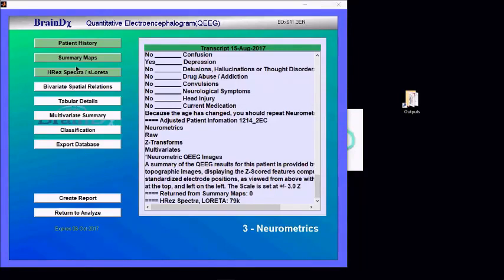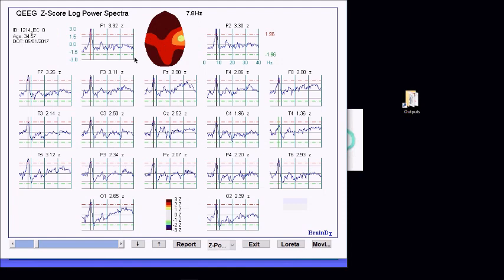Having looked now at the wideband information, we have the opportunity, or the necessity actually, to recalculate the same information with the same methodology, but now on a high resolution spectra. So instead of delta, there are 0.4 hertz steps. That's the high resolution. Instead of being 4 bands, it's 0.4 hertz steps.